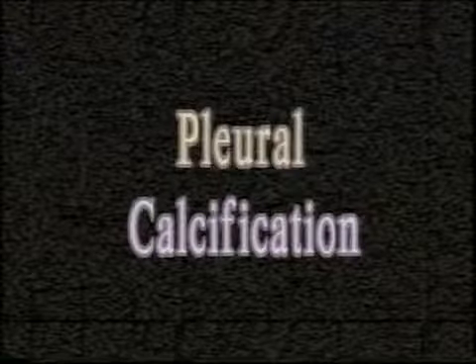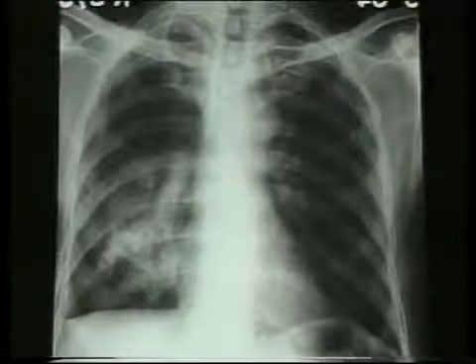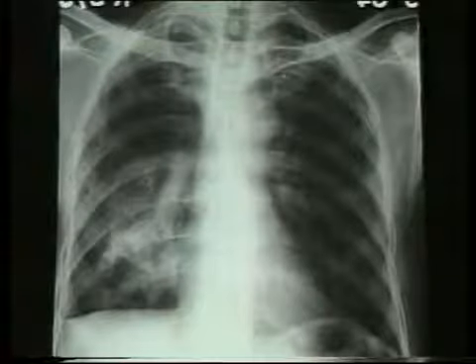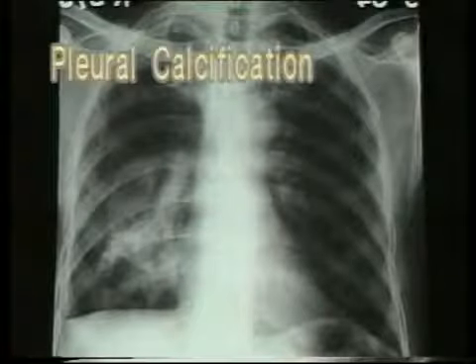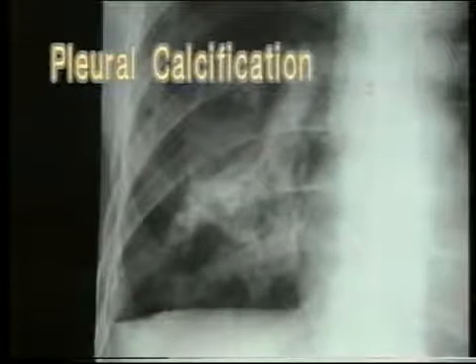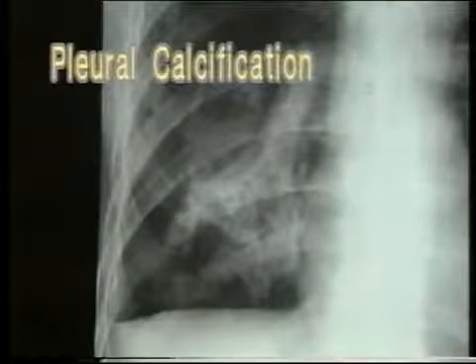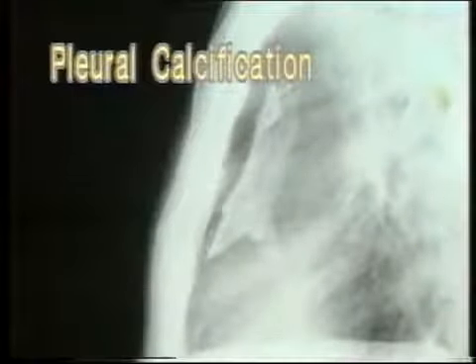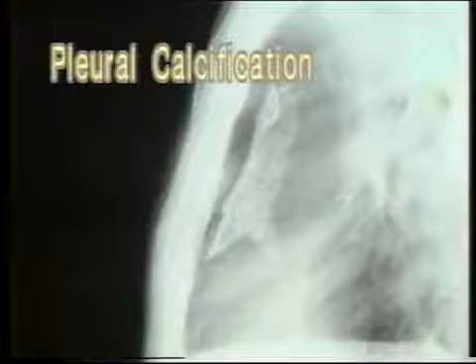An after effect of a pyothorax is pleural thickening and in some cases pleural calcification. Note the irregular dense opacity in the right mid and lower zone. It is denser than the bone and is distributed irregularly. This is a typical shadow of pleural calcification. Note the extremely dense shadow which is sharply defined. If there is any doubt, a lateral or a tangential X-ray should be taken. The shadow of pleural calcification is seen to lie along the chest wall.